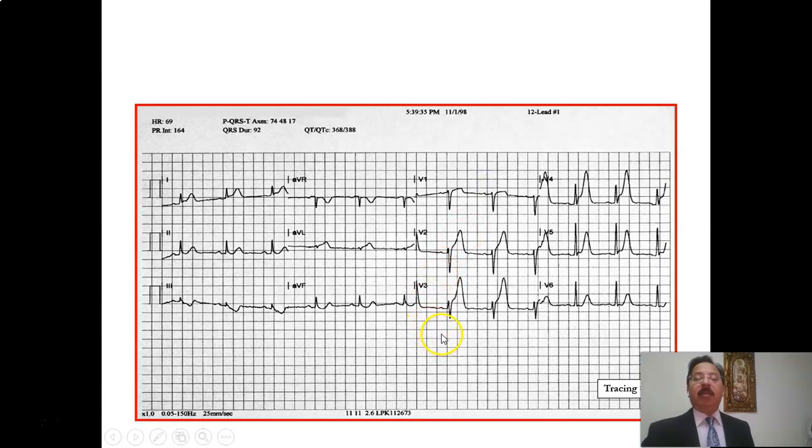Look at this ECG. Is there any ST segment elevation? Yes, in V1, V2, V3, V4, even 1 and AVL as well. And remember that in limb leads you just need 1 mm elevation, and these are the reciprocal changes in lead 3 and AVF. So this is your anterolateral myocardial infarction.